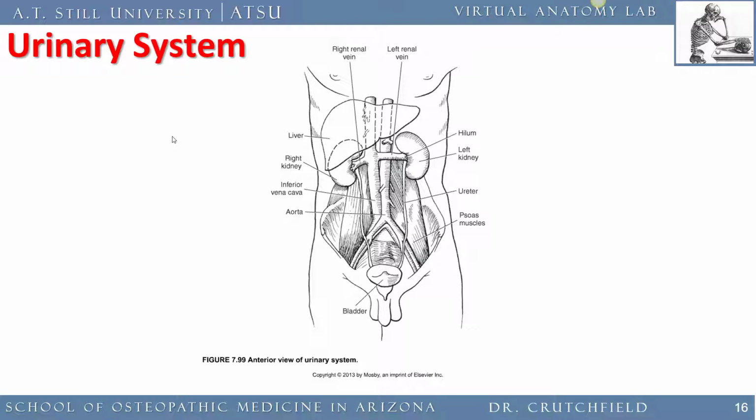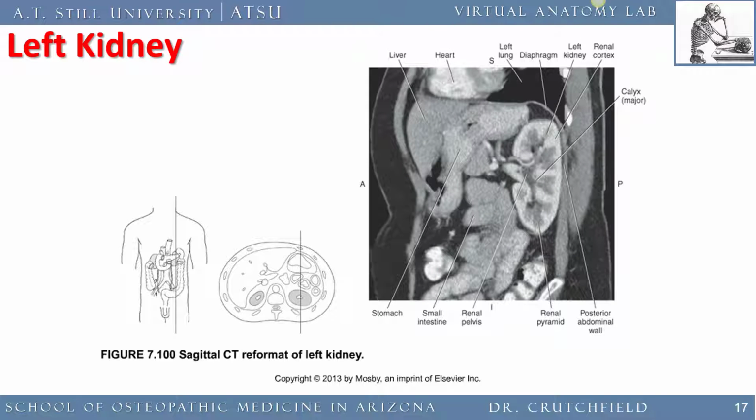In a previous talk I gave you on imaging of the urinary system, we spoke about how the water goes over the bridge, and sometimes water goes under the bridge, and all those crazy things that surgeons try to remember where the ureter is located. But this is a pretty good rough diagram of what we're going to delve into. Here we have a sagittal image of the body taken just to the left of the midline. So here we're looking at a kidney that's been sectioned in its sagittal image.